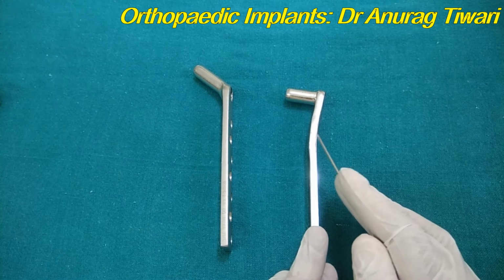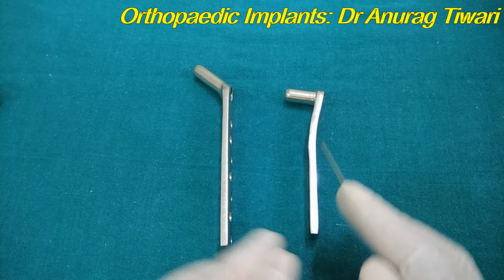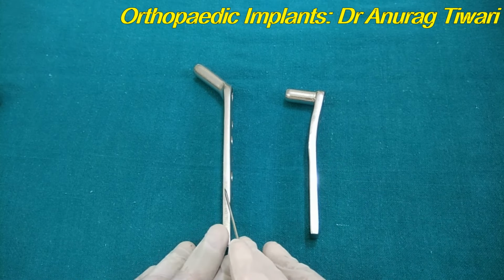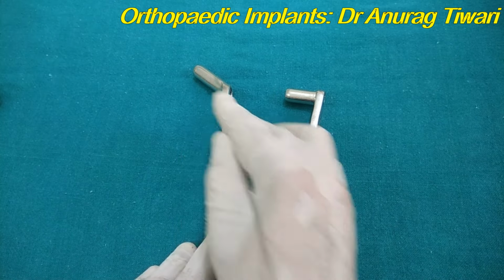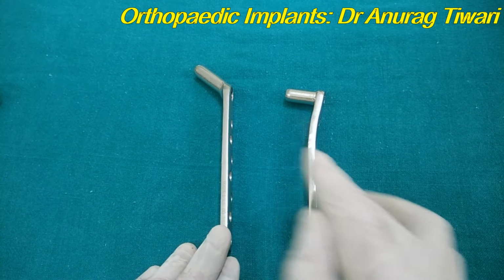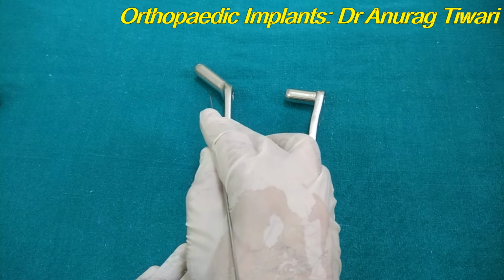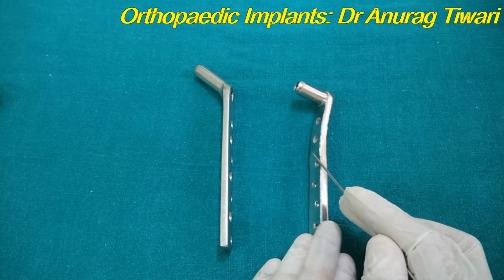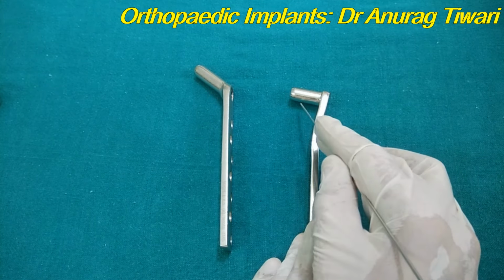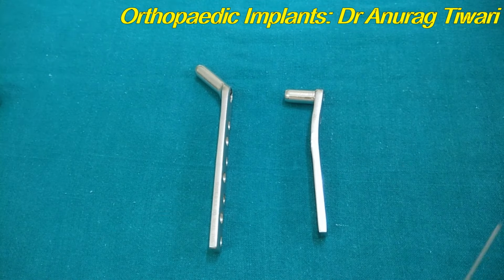However, they are now used mainly for subtrochanteric or intertrochanteric types of fractures, or valgus osteotomy, the DCS. The main difference between the two is the angle, that is the neck shaft angle or the barrel plate angle. This is the barrel, this is the plate, barrel plate. The angle between the barrel and the plate is around 125 to 140 degrees, whereas in DCS it is 95 degrees. So this is the basic difference between the two.